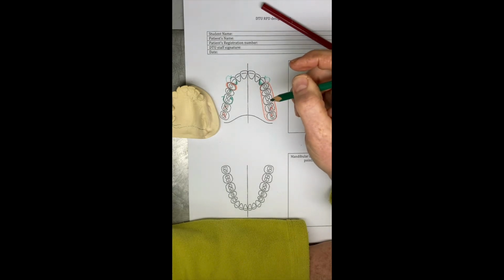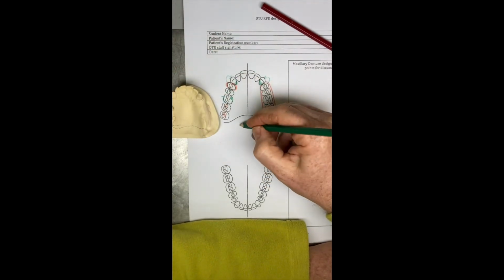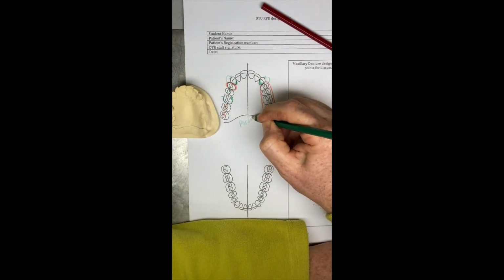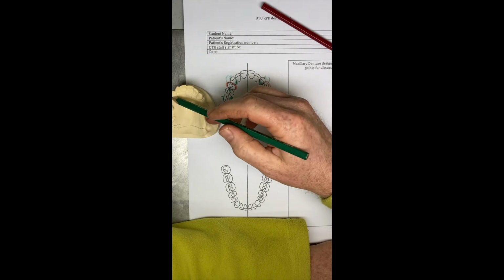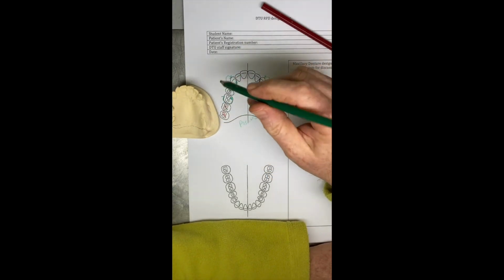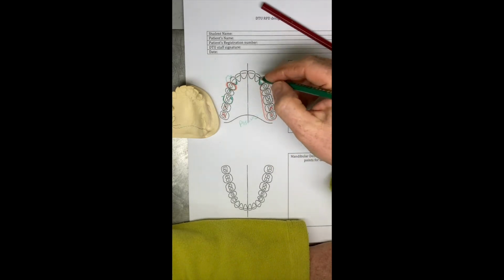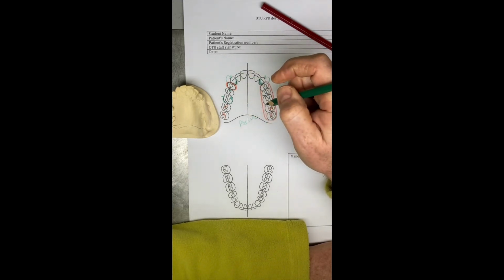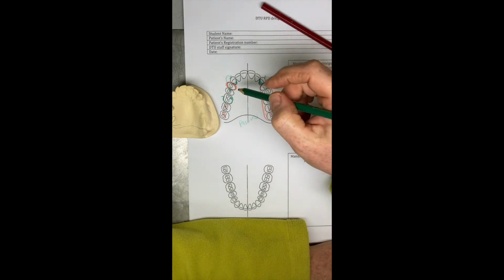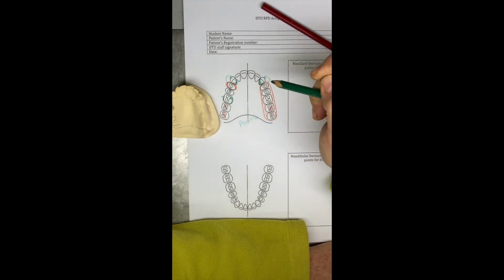Okay, so once we've got our clasps on, we can think about path of insertion. Again, with this one, I'd make the path of insertion equal the path of displacement, keep it simple. There's not a great deal of undercut distal to these canines to engage, so I'll just leave it as it is. Wherever we've got a clasp tip, we need reciprocation, so we need to incorporate our reciprocation into these cingulum rests by the rest seat preparation that we cut. And then with this occlusally approaching clasp here, we'd incorporate our reciprocation into this part of the clasp arm here.